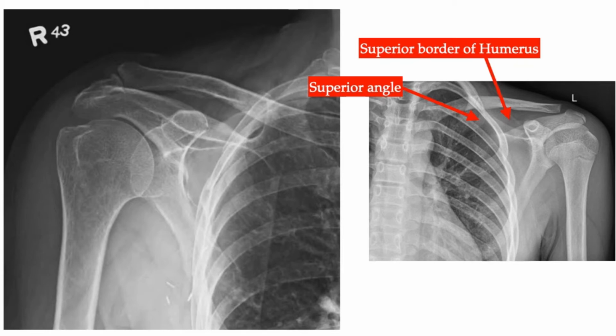For example, in posterior-anterior view, the direction of the X-ray is from the posterior to the anterior side of the body, and hence the bones present on the posterior side of the body wall, which are the vertebral column, scapula, and posterior end of the ribs, will impart a brighter shadow on the skiagram compared to the bones present on the anterior side, which are the clavicle, sternum, and anterior end of the ribs. And hence, by seeing these, I commented it is a posterior-anterior view of the shoulder region.